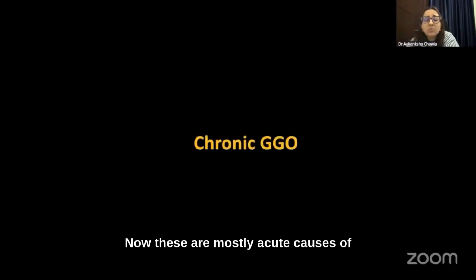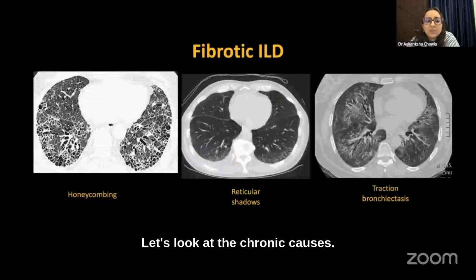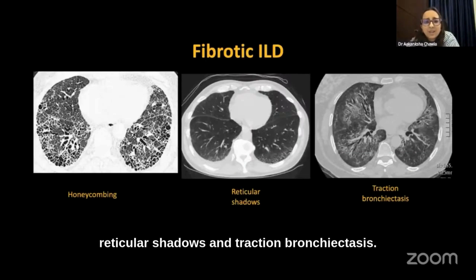Now, these are mostly acute causes of ground glassing. Let's look at the chronic causes. Now, we know that in fibrotic ILD, you see honeycombing, reticular shadows, and traction bronchiectasis.